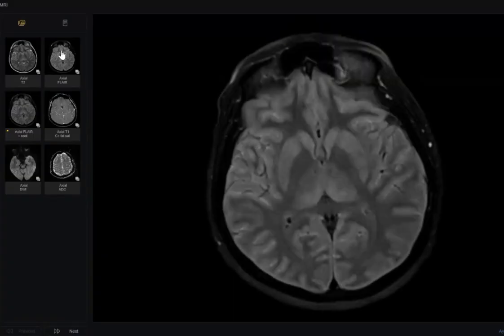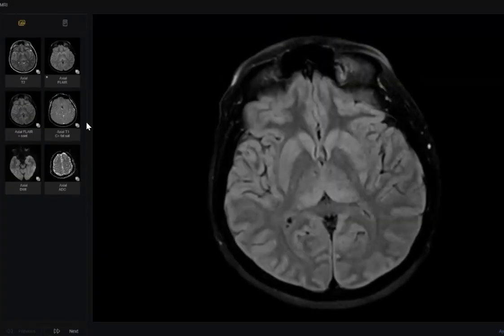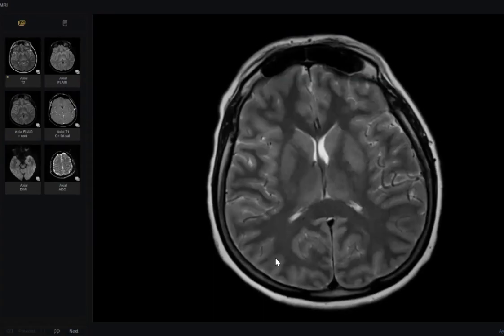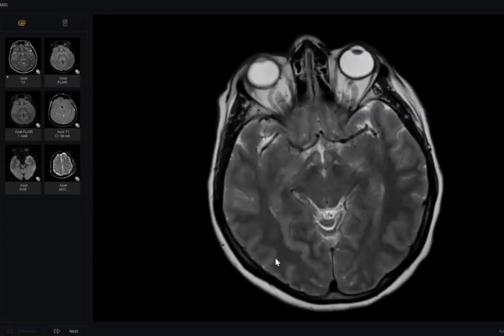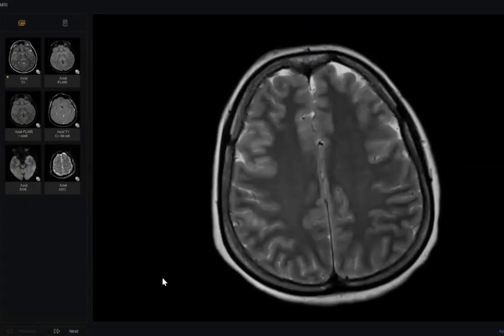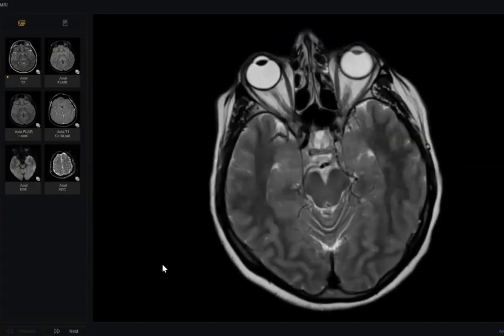What happened here, my colleague? Look here, from the beginning, there is in T2 at least abnormal bright signal in the basal ganglia, but at least very obvious here in both medial or mesial temporal and the hippocampus. At least you should tell about this. Second, don't forget, doctor, please, the history. Why did you start with the orbit?